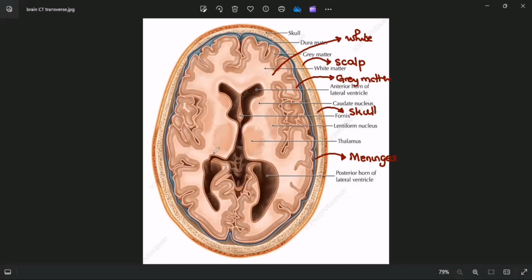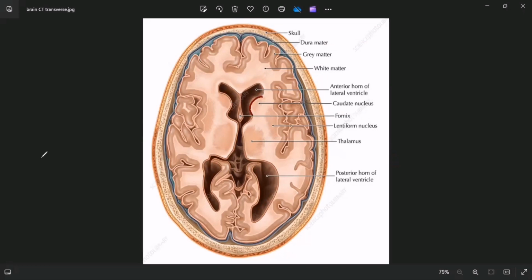Good. So, as you can see, this is the ventricle. Okay, so the space there, ventricle. Do you see that? Are you ready to zoom? Are you ready? Good. Now watch here. Look at the structures that are around the ventricle, the periventricular structures.